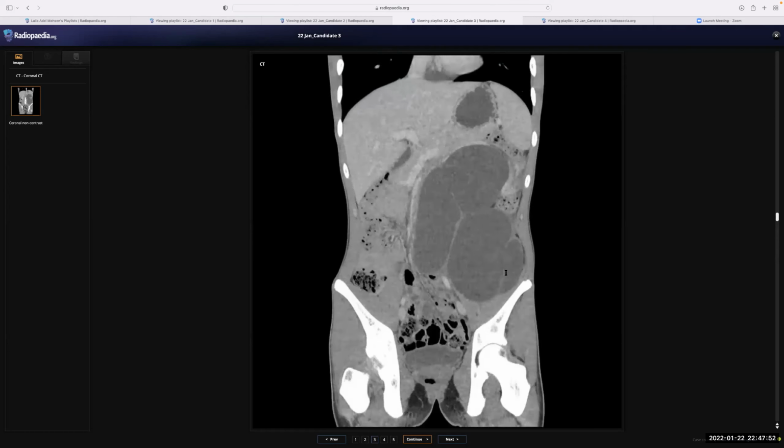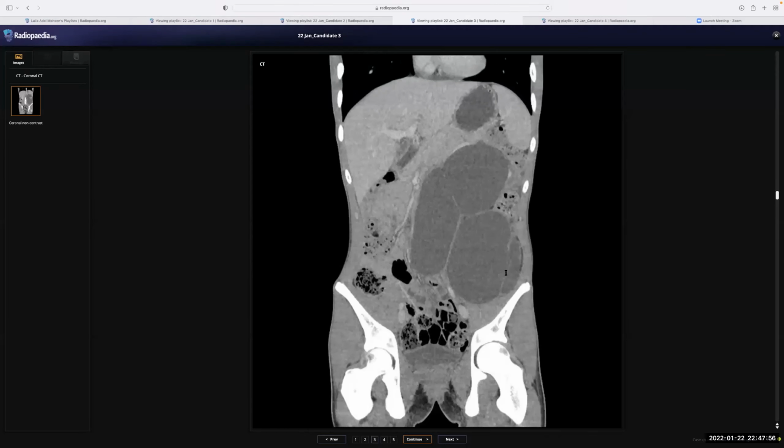Okay. Can you suggest what the possible reasons for this could be? It could be hydroureter, or it could be end stage of vesico-ureteric reflux, or there is an obstruction downward in the lower part of the ureter, which gives this hydroureter, megaureter, I mean. Okay. So do you recommend any further investigation? Well, contrast enhanced axial CT, or MRI. What will the MRI add? CT is much better, just to see also if there is any calculus or stone down in the lower part of the ureter which causes such obstruction.